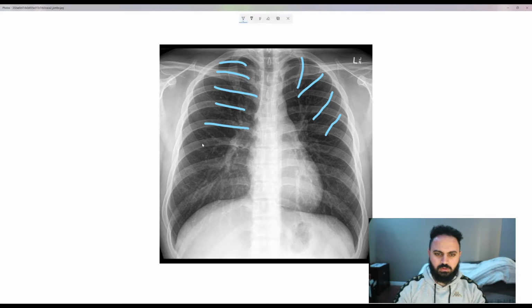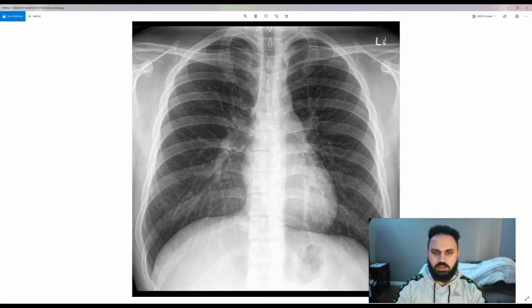Make sure that there's no obvious fracture, and there's no malalignment or missing ribs, and something that might give you a hint to what's going on. Sometimes you'll see destructive processes within the ribs as well. And then with fractures, you might want to start paying closer attention to pneumothorax or hemothorax, in the event of a trauma, etc. So that's kind of what I look at next.